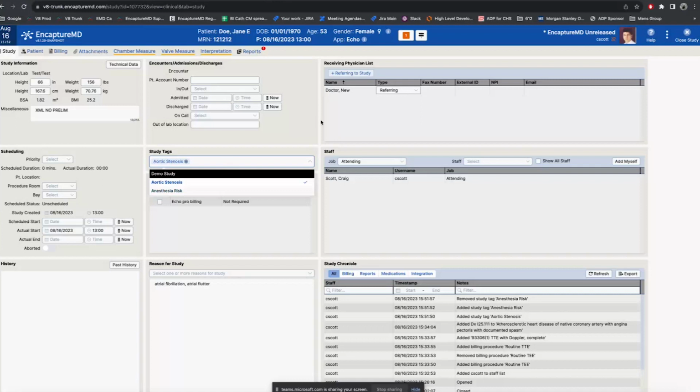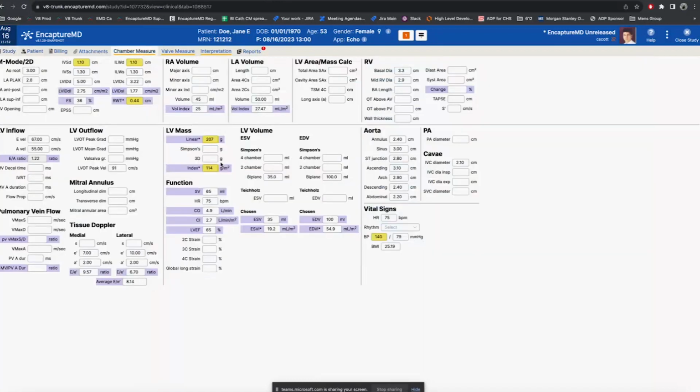The other thing here I think we can touch on is that the system is mapped for almost all ultrasound machines. So whatever machine you have, the information should just flow in here. What we typically do during Go Live is we ask you to send us one study with every measurement type that you want. Open it, see if it all goes where you expect it to go, just to make sure that our systems are in simpatico.